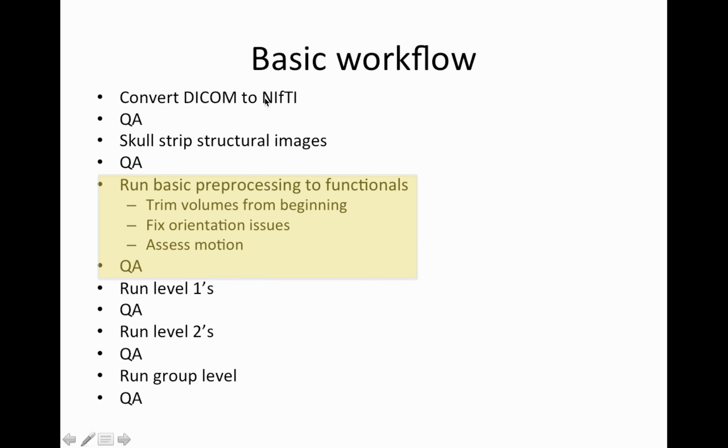So you've already converted your DICOMs to NIfTI. I will put a link here to a blog post where you can get some tips on that. And hopefully you've already skull stripped your structural images and run the QA step. I will also put a link here to the video that covered that.